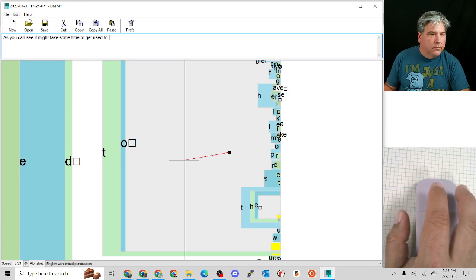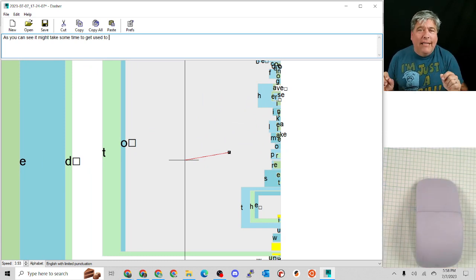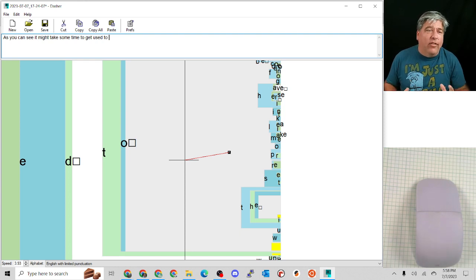As you can see, it might take some time to get used to. All right. So like I said, I can say anything with this, and I love that about Dasher.